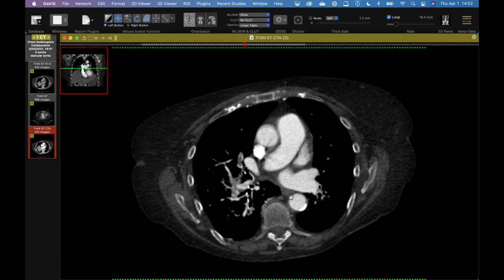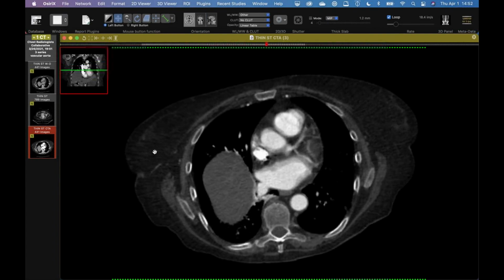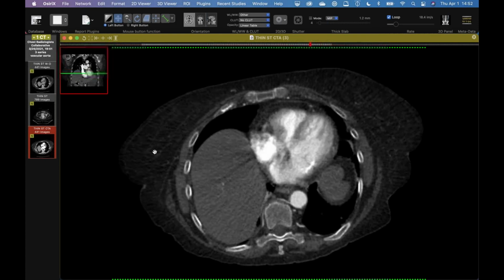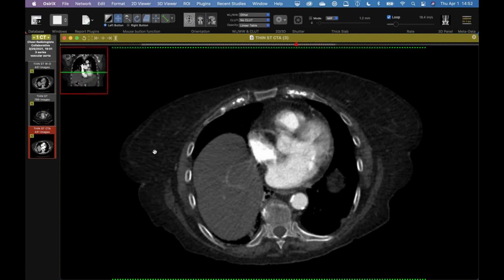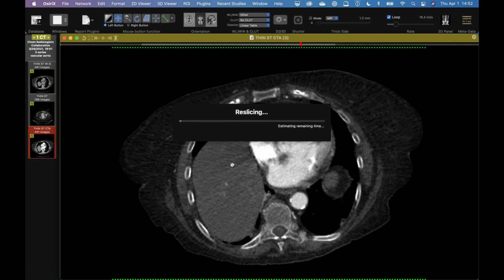But did they get an echo? What? Did they get an echo? I believe so, and I don't think they found a shunt, if I remember. Okay. Yeah, because us not seeing it, I mean, we're not great. Oh, I know. Yeah, I know. We don't find them unless we get lucky usually. Yeah. So some kind of in situ clot, but it's just kind of a crazy looking thrombus.